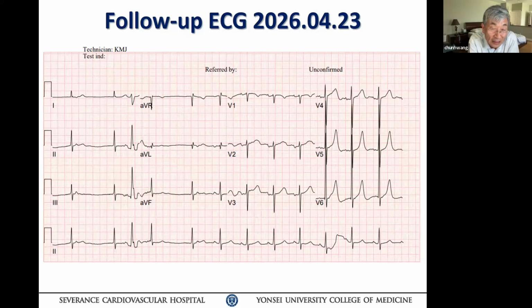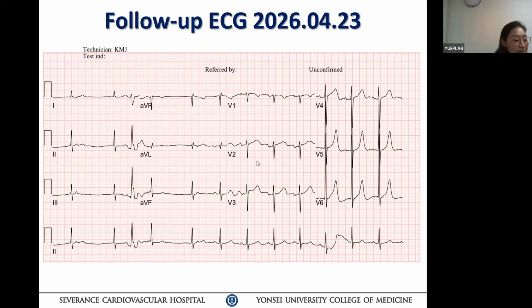Otherwise, you do not explain why this patient's heartbeat is all over the place from the beginning. So he has some PACs with different coupling as well. Yeah, because after all this mitral valve surgery, all those ablations you did, I think there is still some issue. Did this patient undergo the Maze surgery also? Yes, I found some notes saying Maze. Yeah, okay, that's one note. That's why the P wave amplitude was small.